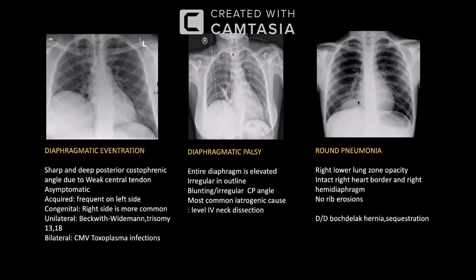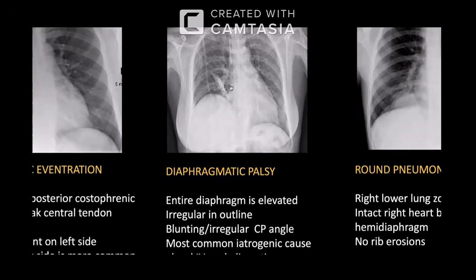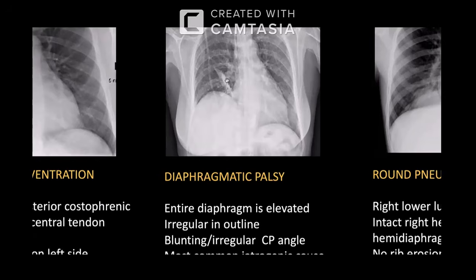So you have to refer this case for an antibiotics review after 4 to 6 weeks post antibiotic course, and then repeat the chest X-ray. For the central one, you need to refer for physiotherapy to recover from the diaphragmatic nerve palsy. She mentioned something on this side, but this opacity could be a part of plate atelectasis. Usually plate atelectasis can happen, but horizontal is kind of rare.